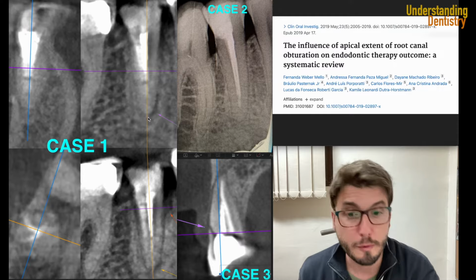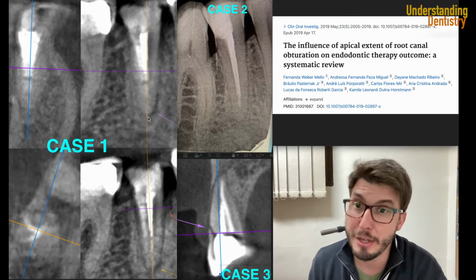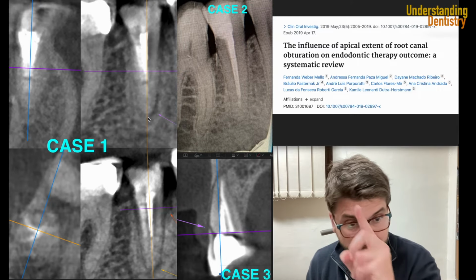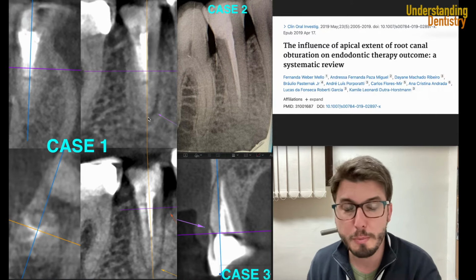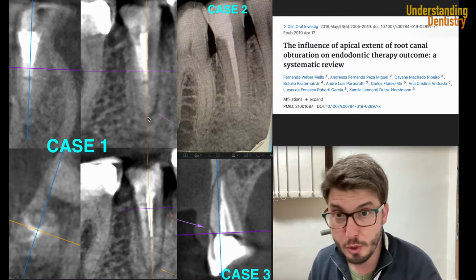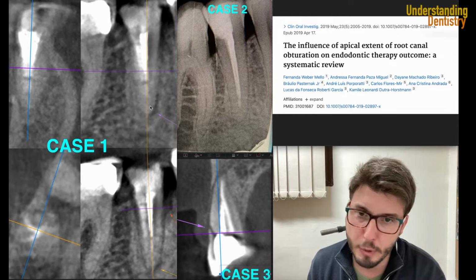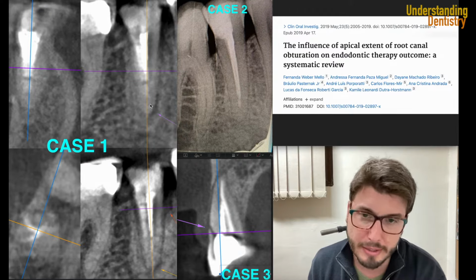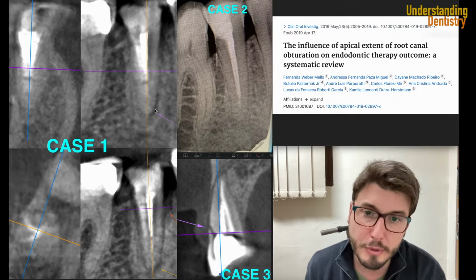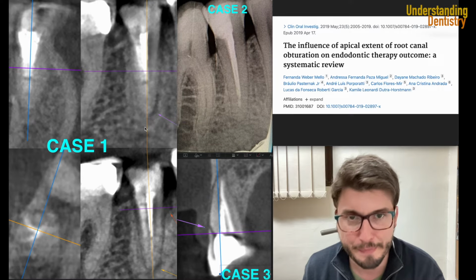You could follow up, for example, but this could also be some fractures that are still starting to develop. Don't forget that the end of the fracture usually leads to periodontal ligament space widening in this area. So that's also very important. Here, it doesn't seem to be the case. Maybe it's an oblique canal, or just a divergent root canal here. And then there you have the periodontal ligament space widening happening here.